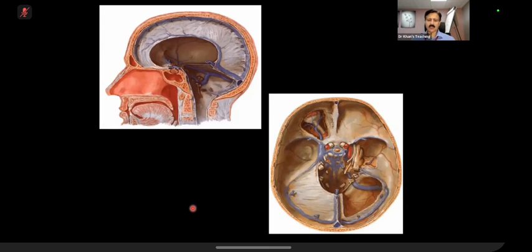Subdural hematomas cannot cross the midline, they go along the falx, they can go along the tentorium. For the exam this is very important because a subdural hematoma will go along the tentorium, and this is the hiatus. So the midbrain is sitting here, and it might go here, it might go along this.